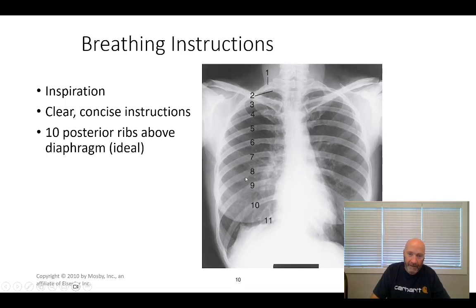And the reason it disappears is because you don't have anterior ribs. You've got a small portion of anterior ribs, but most of what we would refer to as anterior ribs are what we refer to as costal cartilage. So that's cartilage that attaches from the rib and goes all the way to the sternum. So if it doesn't look like it's touching the spine, it's anterior rib. If it does, then it's posterior rib.